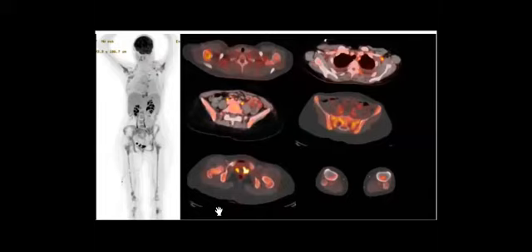What do you see else? Nice differential. So with these lymph nodes, you will think about maybe lymphoma as a good differential. And also there's pleural effusion. Do you agree? And there is low grade uptake in the bone, diffuse uptake. So no focal uptake, it is all diffuse uptake. But there is some lymphadenopathy. So lymphoma is a good differential. What else?